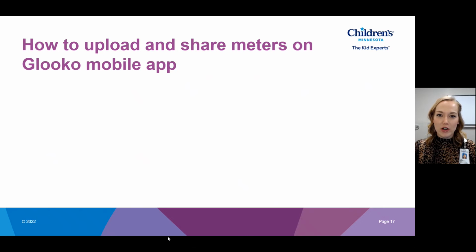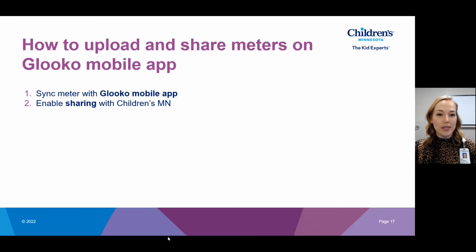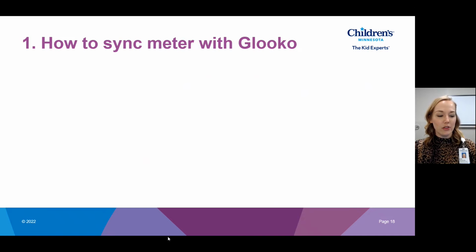So how do we upload and share our meters on the Glooko mobile app? There are two steps we're going to need to do. First, we need to sync your meter with the Glooko mobile app, and then we need to enable sharing with Children's Minnesota. So let's learn how to sync this meter.